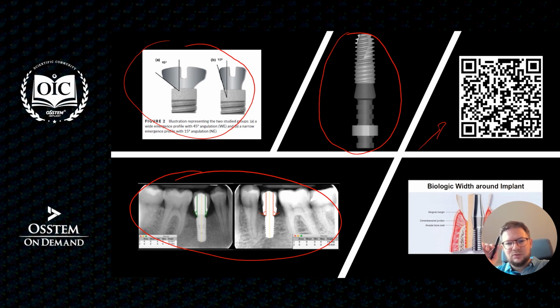So you can download 3 presets for different applications, and all is designed on the basis of the current knowledge, suggestions, and guidelines of the Ostem implant company for choosing the proper size implant, abutment, or different components for a specific site in the oral cavity.